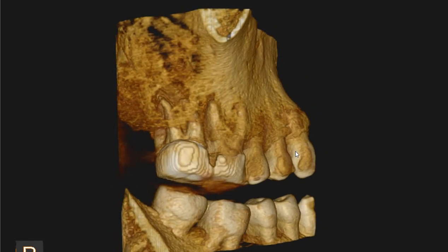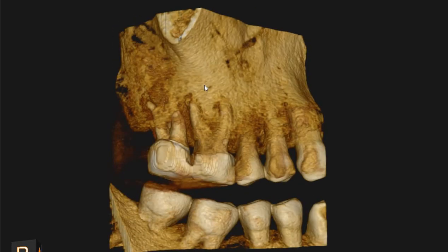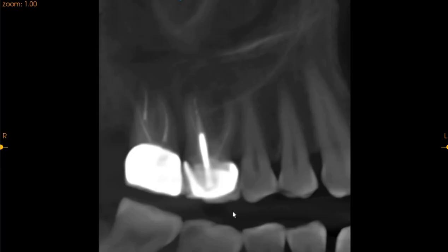This is the high resolution endodontic mode of the upper right segment. The area of interest is the 5, the 6 and the 7. Here you can see that both the teeth are root canal treated. We've got periapical radiolucencies around, and now we'll show you from a transaxial view what the teeth are showing.